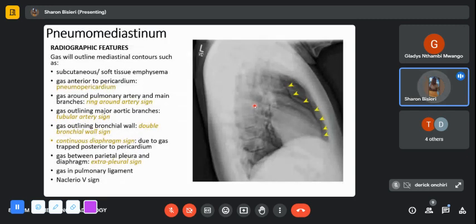All right. So since we've gone through the signs of pneumomediastinum, and the answers are to the left of the screen, we can mention them as I go through the images. So what can we see on the radiograph on the right? Derek? Yeah.